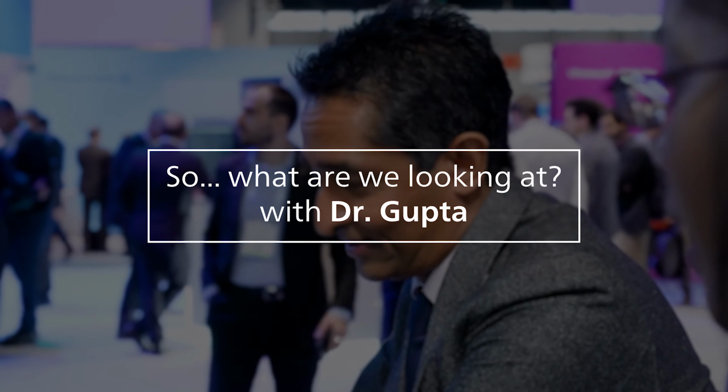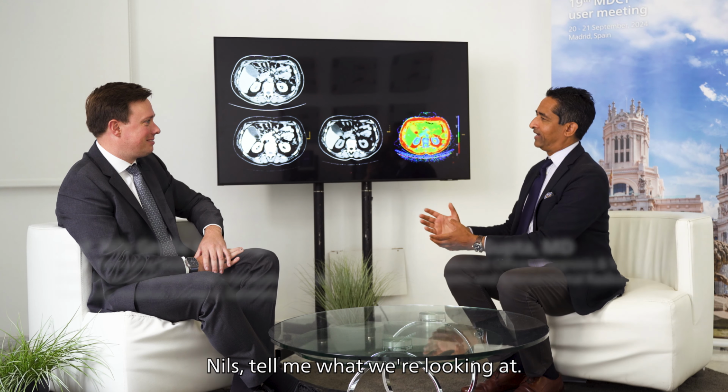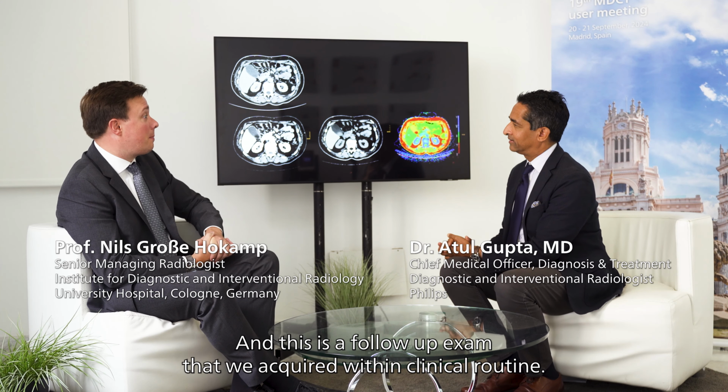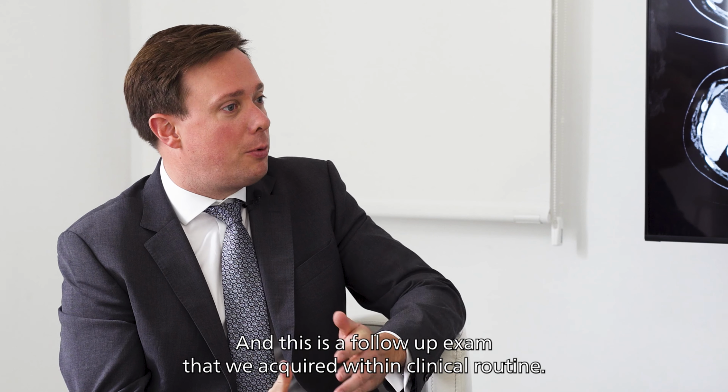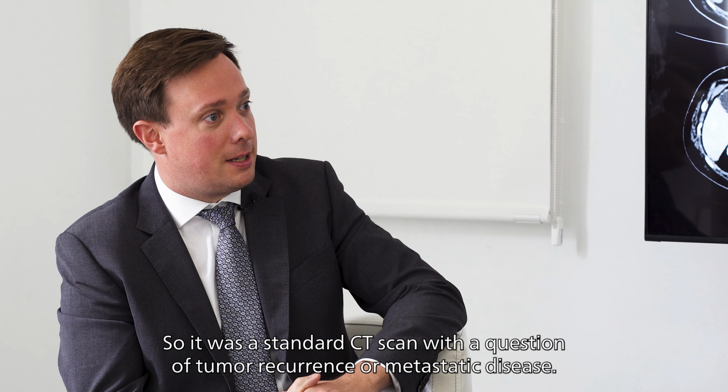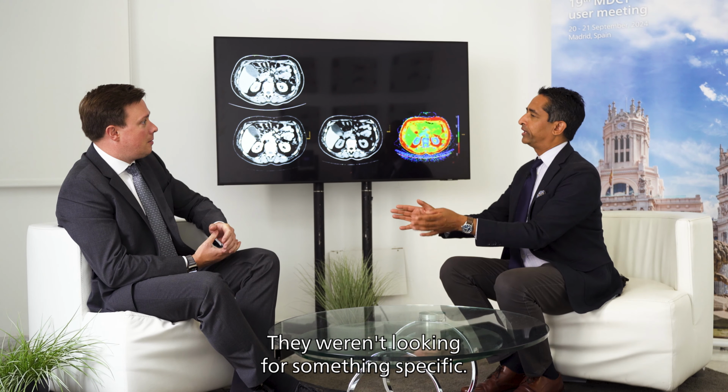So, what are we looking at? Nils, tell me what we're looking at. Hey, so what I'm showing here is a case of a patient who underwent upper GI surgery for cancer, and this is a follow-up exam that we acquired within clinical routine. It was a standard CT scan with the questions of tumor recurrence or metastatic disease. So they weren't having belly pain, they weren't looking for something specific.